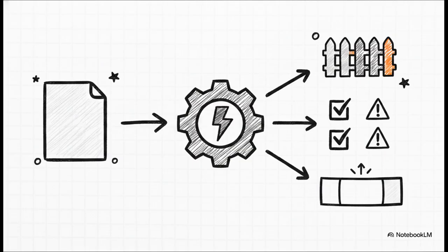Pylinac's algorithm takes care of all the heavy lifting for you. It automatically loads up your EPID DICOM images, finds all the MLC peaks, and calculates the errors of every single leaf relative to the picket. It then spits out these super clear pass, warn, or fail visual overlays. And honestly, the coolest part, it automatically accounts for specific source-to-image distances, off-axis panel translations, and even EPID sag.